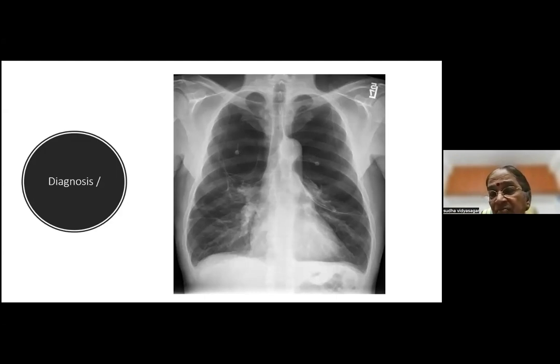And you can see the edge of the bulla, which is actually compressing on the next part of the lung here also. So you can see multiple bullae here. Okay, 3, 4 are there. And they're all compressing on the adjacent lung. So this patient definitely has multiple bullae.